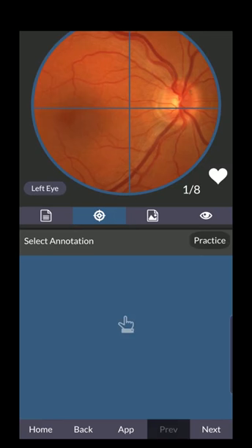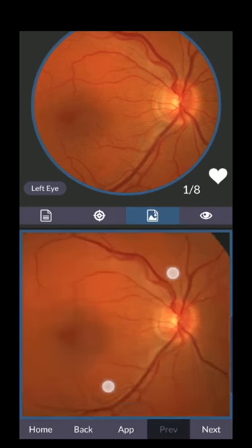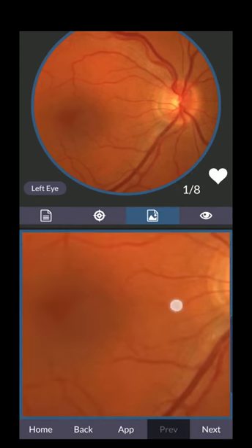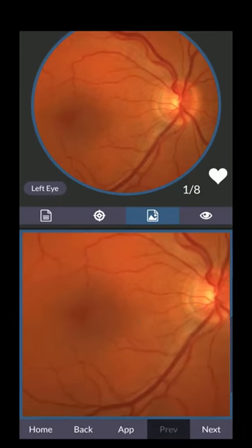The next button allows the viewing of the image that's displayed to the simulator attachment, because remember, the simulator is going to be attached to the top end of your phone. It'll allow you to view the image that you're looking at by depressing it. It allows you to see the image on the lower screen. And by using your pinch function on the lower screen, I can enlarge the image and move it around in order to see what is going on inside the simulator without actually removing the simulation hardware that comes with your purchase.